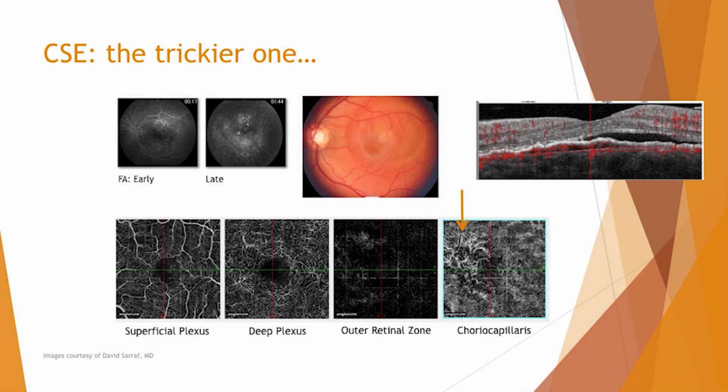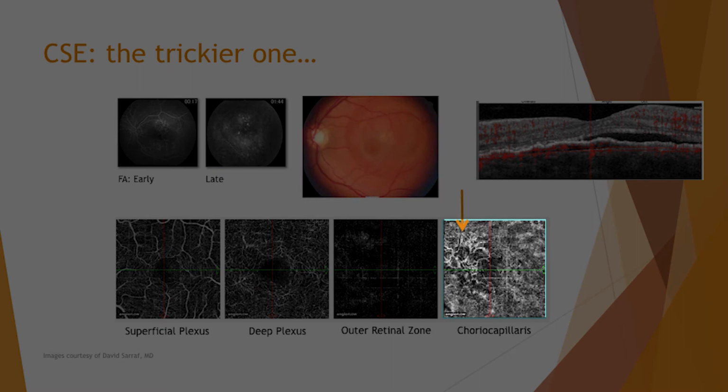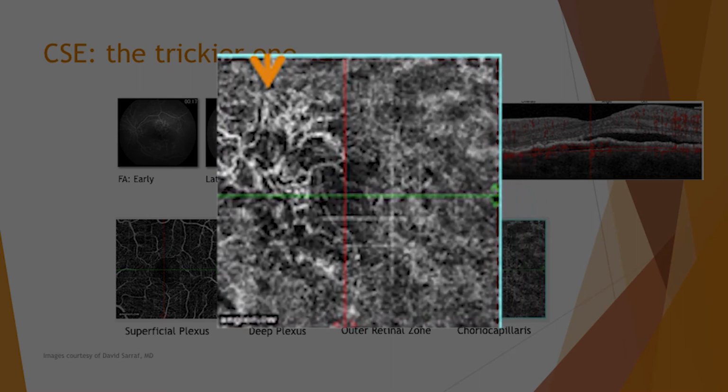The fluorescein confirms that there's something going on, okay? But the OCTA solidifies it. So look at the choroid. Remember, occult CNV is usually associated with chronic CSR and PED. Remember that occult CNV is messy and large and doesn't usually affect the foveal avascular zone.